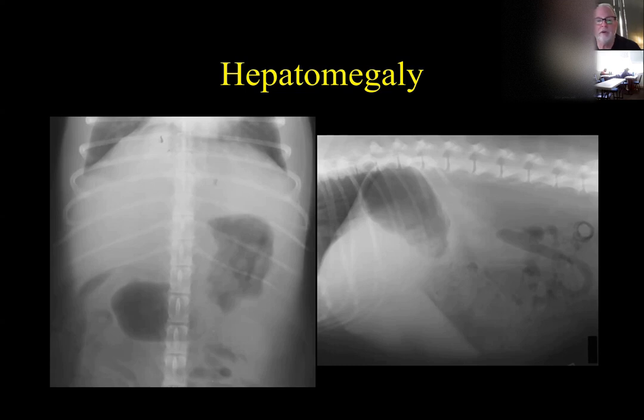If the dog has clinical signs of Cushing's disease and is PUPD, then it could be Cushing's disease that's causing the liver to become too big. So the etiology, a list of reasonable differentials of why the liver is too big, is dependent on other things like the clinical signs, the history, the age of the animal, and you would re-rank those differentials based on that information.